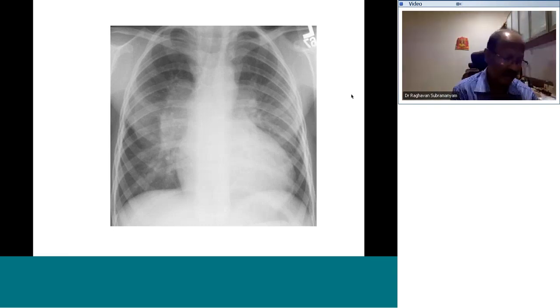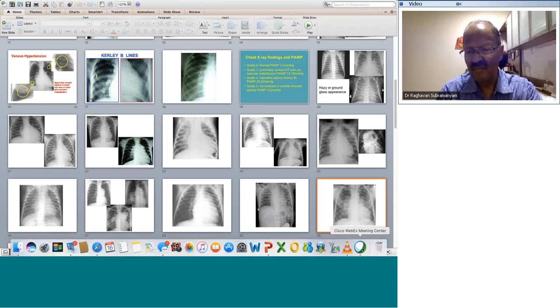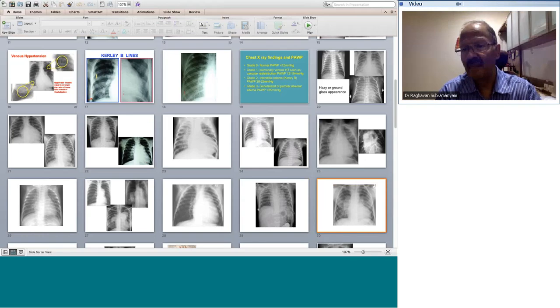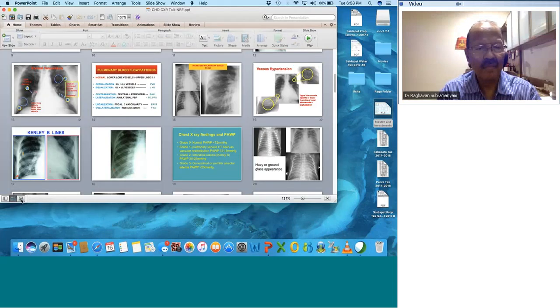Okay. I'm going to give you 30 seconds to interpret this X-ray. Any thoughts on that?